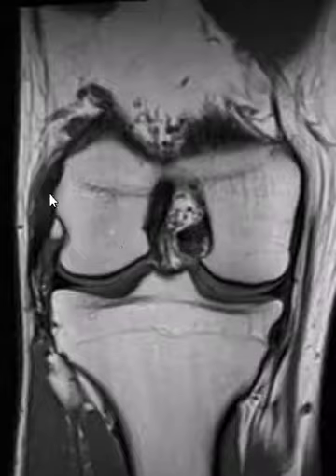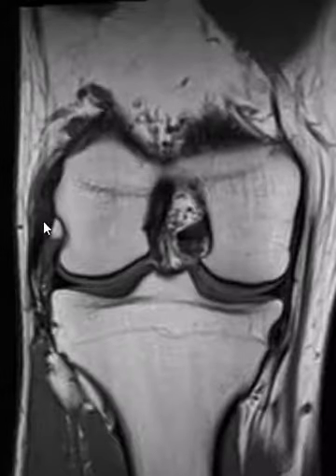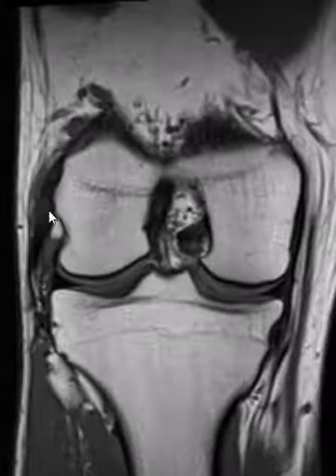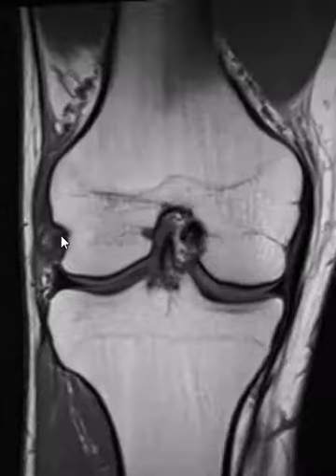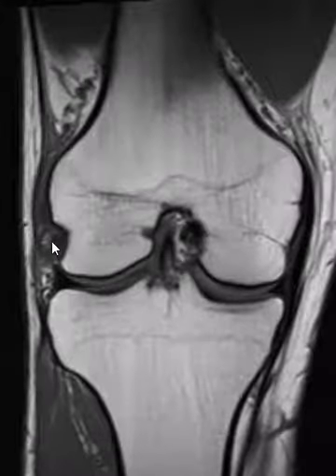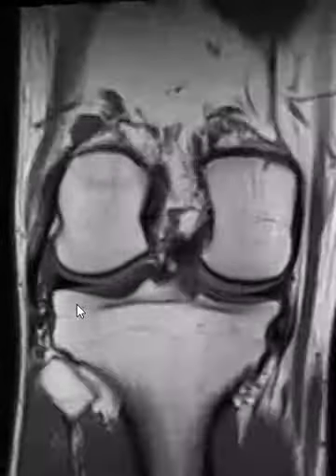So here we go. One more time. This is the fibular collateral ligament. Normally this is much better defined and dark, but here it's foggy, kind of bright and thickened, and the popliteus tendon beneath that. Normally we can see something relatively dark. It can be hard to see here with magic angle phenomenon, but there's just a little bit too much signal within the popliteus tendon underneath that as well. So they had a couple findings.